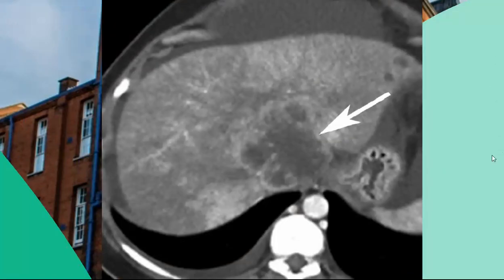Here is a CT of the liver. There's free fluid around it, but here is a heterogeneously enhancing intrahepatic mass, compressing the hepatic veins with tumor thrombus within the intrahepatic cava. Note this heterogeneous enhancement and diffuse edema of the hepatic parenchyma.